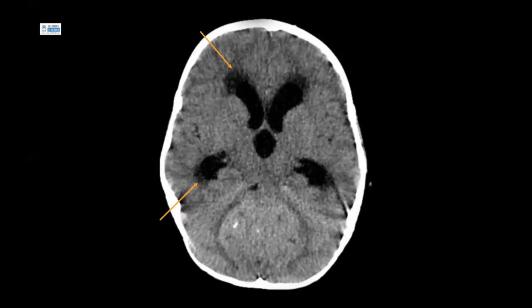So just to look at some pathology then. This is a non-contrast axial CT brain image. We can visualize there's a large mass here located centrally within the posterior fossa. I don't know if you can appreciate, but it's slightly hyperdense on CT. And this points towards the possibility of it being a medulloblastoma. And this is a 6-year-old child.